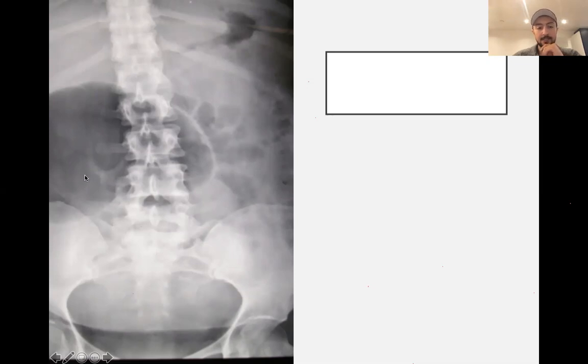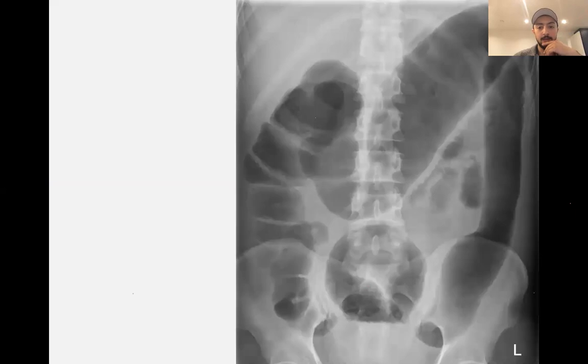Okay, so these are the types of large bowel obstruction. You can have small bowel obstruction, or you can have large bowel obstruction. And so causes of large bowel obstruction, as you've seen, are sigmoid volvulus, cecal volvulus, and tumors or cancers. Now again, this is another characteristic pathology. Anyone want to have a go? This one?